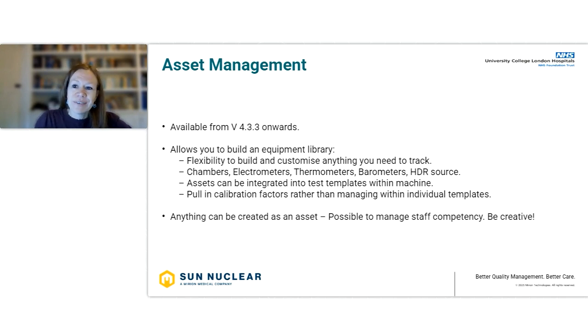So that's what we mainly use it for, but you can be as creative as you want. The functionality is there to create anything as an asset. I think I mentioned that you can actually put people in there as assets and use it as a sort of staff competency database. So you can attach documents to that member of staff showing evidence for their competencies, and you can set expiries for the different competencies, and keep track of things like that. So you can be as creative as you want with it.